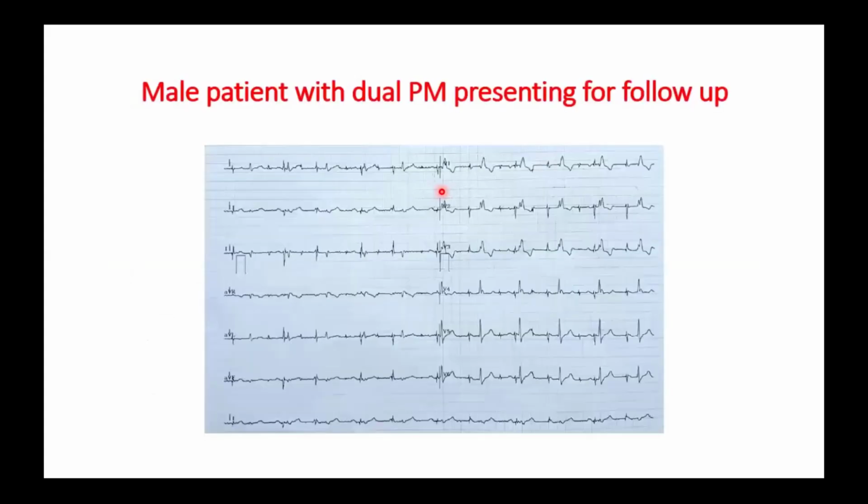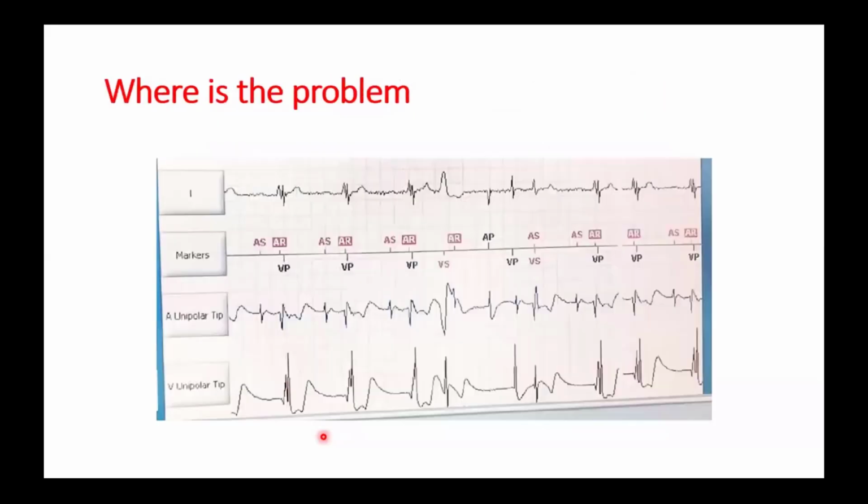So we have those final two cases, which are very interesting. Actually, this was a male patient who had implanted a dual chamber pacemaker and presented for follow-up, and here is his ECG. Take 2 seconds to evaluate this ECG. Okay. Then here's the interrogation.